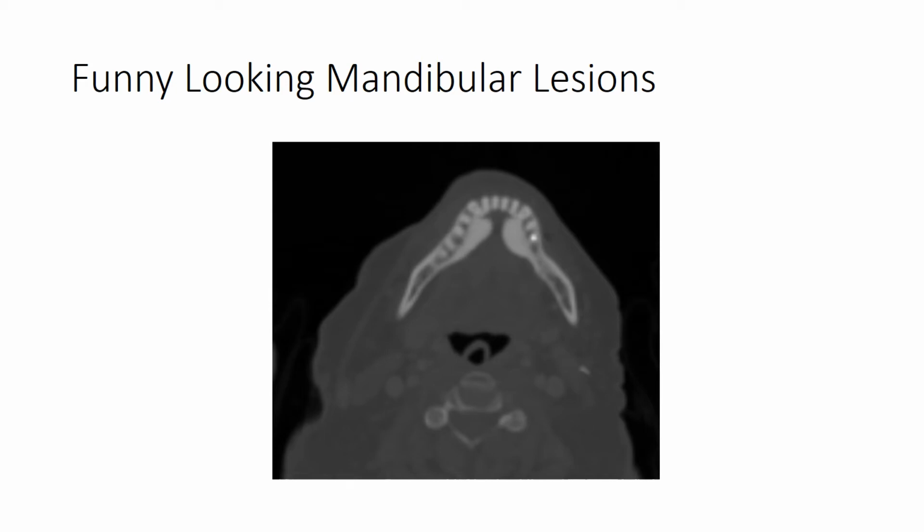And you can get this in the palate, the midline palate, and it's called a palatal torus. And when you get them bilaterally on the lingual aspects of the mandible, usually adjacent to the mandibular premolars, this is called mandibular tori, or you may hear it as torus mandibularis. This is completely benign. They are not tumors, and they don't need to be treated.